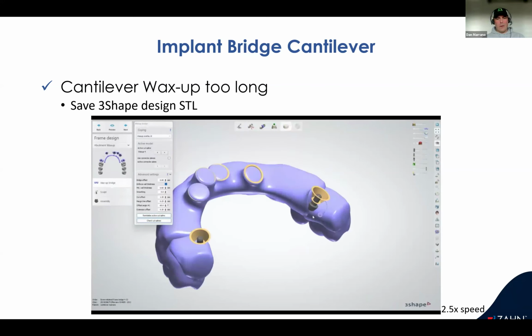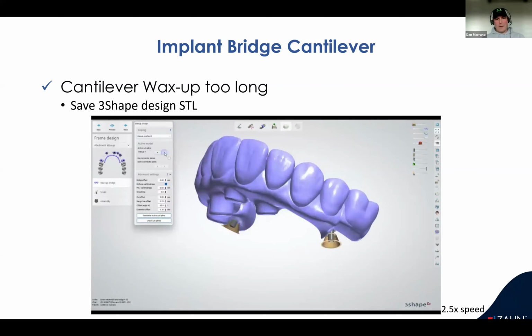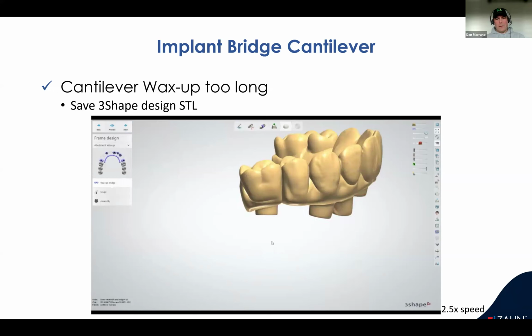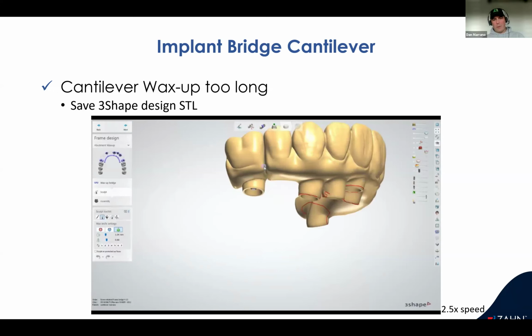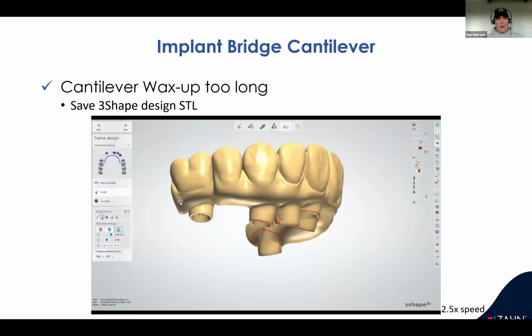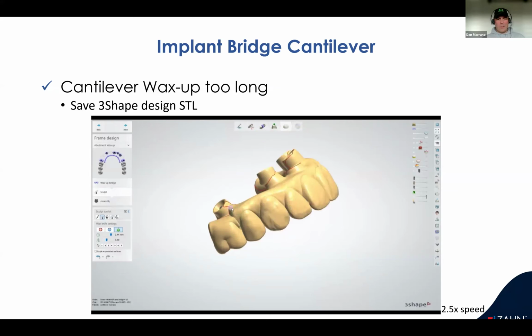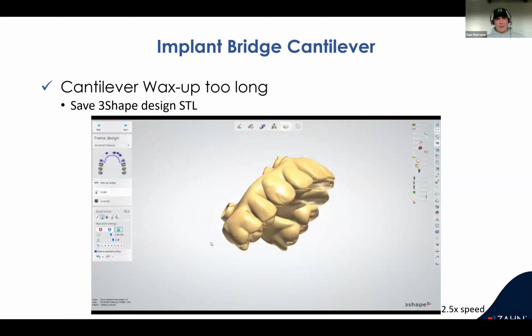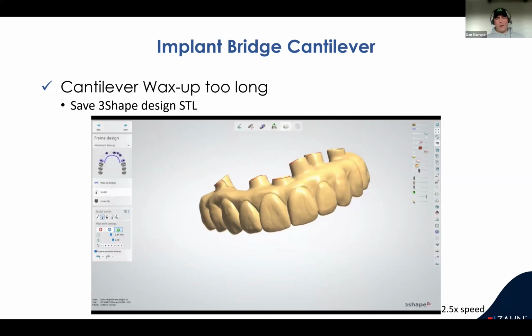We just do our nice wide circle. You could have probably cleaned this up a little bit better. Again, for the demo, I was just doing it real quick. And if they were 3 individual pieces, it would cut it out or error out. Now you can see it's one connected piece. We just clean up that area. We didn't have to touch anything else. They all have the same aesthetics they love, and we're done. It's a really nice feature. We use it probably a couple times a month, possibly.